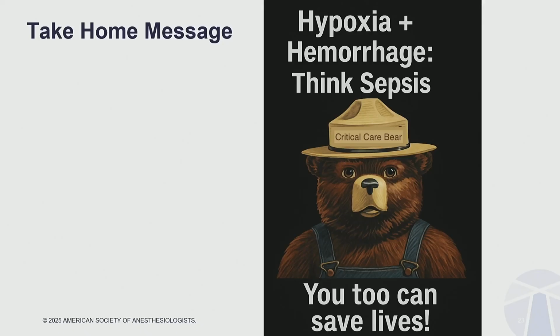Thank you. All right, Dr. Stahl, would you like to respond? Yeah, so you're right that the RV in that case is not totally normal. I guess my point in the imaging is that in the case of an acute AFE or another acute RV event, the appearance of the RV is going to be quite a lot more dramatic than we saw in this case. And so while we see septic cardiomyopathy, while her hypoxia plays a role in her RV function, that was not the primary cause of her dysfunction. But good pickup. Do you want to talk about the diastology?